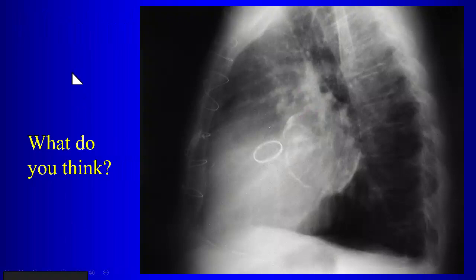Okay? What is calcified here? Pulmonic valve. Not the pulmonic valve, no. What is this? You said, yeah, this is the left atrium. This is the wall of the left atrium that's calcified. So what is the significance of calcification of the wall of the left atrium? Why does that matter? What does that mean? Increased pressure. Okay, what does this tell us about the patient? This is associated with what? What disease causes this? Yeah, rheumatic heart disease. So it's strongly associated with rheumatic heart disease.